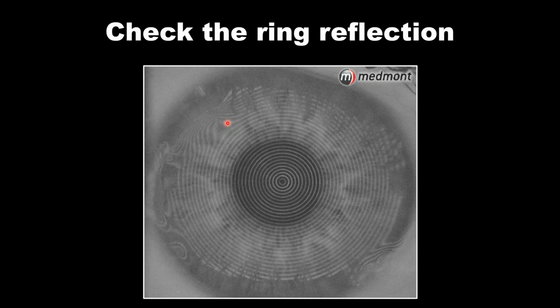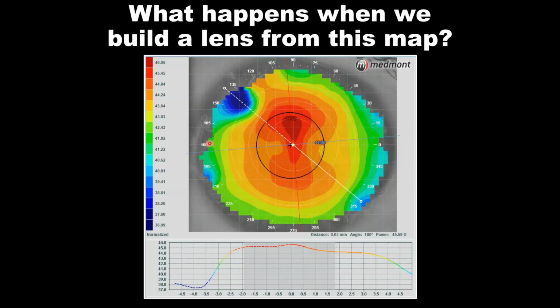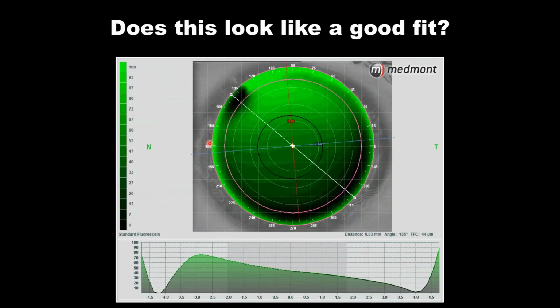Our slit lamp indicated that this patient had healthy epithelium, and there's no history of any disease or trauma or infection in this eye. So why do we have this odd area? It must be poor tear film. So if we were to take this topography and attempt to build a contact lens from it using the contact lens software, you notice something is amiss.